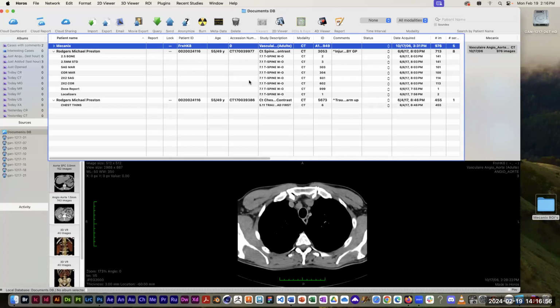Usually, when you open one of these data sets, the data itself actually keeps track of the spacing between those cross-sectional slices. In other words, were the slices taken every 1 millimeter, every 3 millimeters, every 7 millimeters? There's a certain spacing to those cross-sectional slices. And that information is usually embedded somewhere in the DICOM files. So every time that you've opened one of these data sets, whether it's the sample data sets that I provided to you from OSIRIX, or the visible human data sets, or anything downloaded from the Cancer Imaging Archive, that so-called slice interval, the spacing between cross-sectional slices, was already embedded within the data. And so it automatically knew exactly how to stack up the slices to reconstruct it as a 3D model.